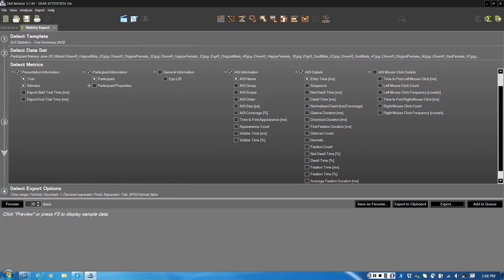Okay, so now we have all of the data that we need exported for both the engage and disengage task as well as the video task, and then we can move on into Excel to process and transform some of the variables that we need for our full data.